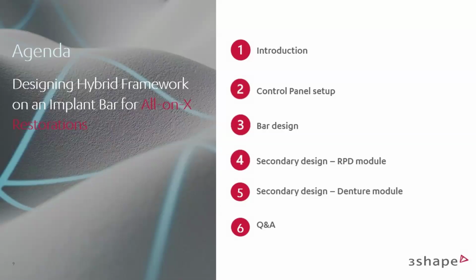And I have a few things on the agenda. I'll start with control panel setup. There are a few things that every user needs to go through, and there's one thing that I wanted to show you because I get questions about it relatively frequently, and I think it's very much an overlooked option. So we will start with something that, regardless of whether you're basic or advanced, you need to do.